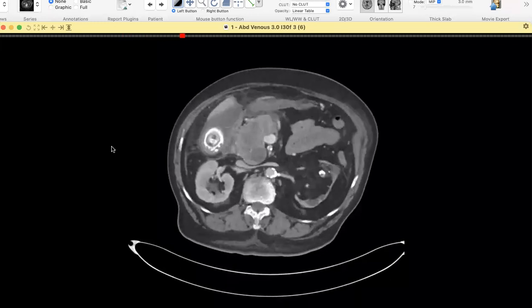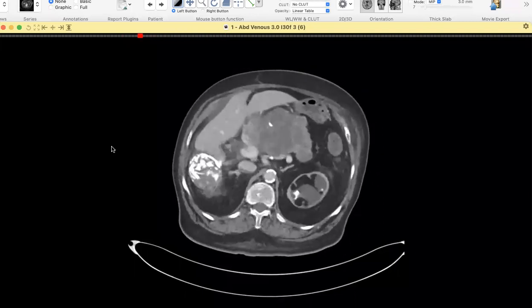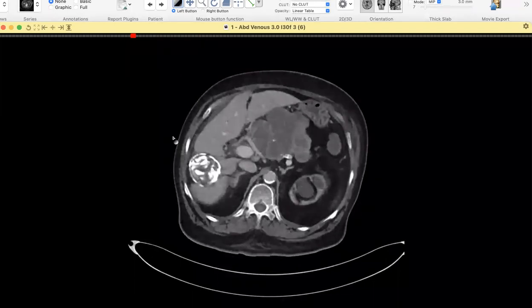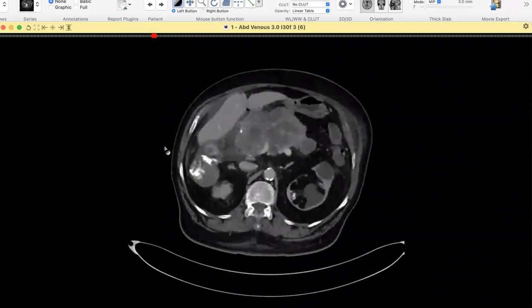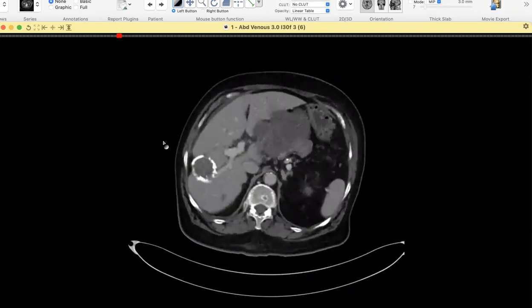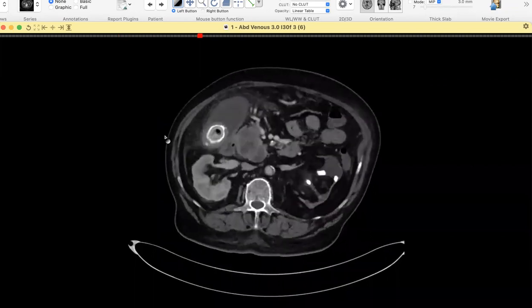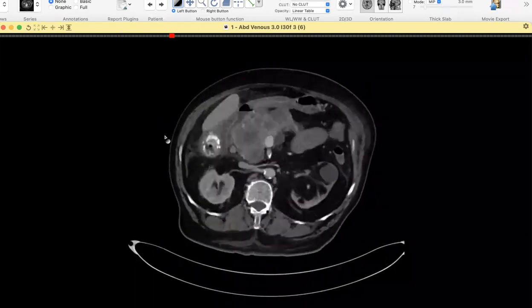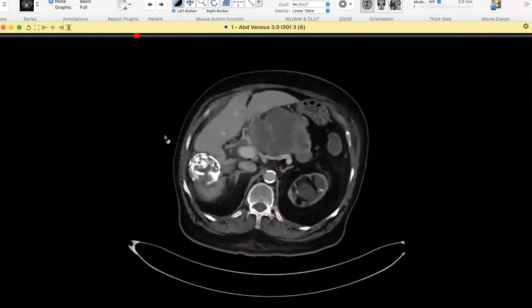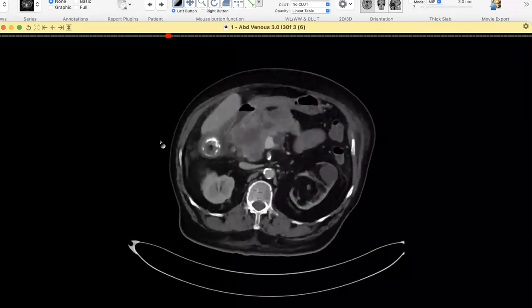the pancreas looks prominent, hugely enlarged. There are multiple hypodense lesions epicentered on the pancreas with multiple calcifications within it. So it could be multiple cysts within the pancreas, or if the patient has acute pain, this could be pancreatitis, with calcifications at the body and the head of the pancreas.